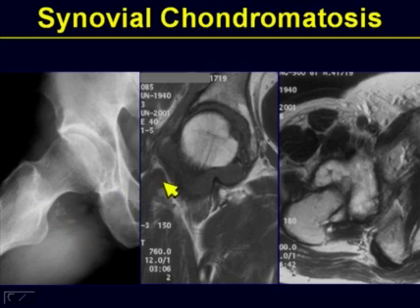and on a coronal image proton density you will see that there is indeed distension of the capsule by uncomplicated fluid. On the actual images at the level of the femoral neck, you'll notice not only the distended capsule but also some synovitis involved. But yet, as you look a little bit closer on the T2 image here on axial, you'll notice these signal voids representing synovial chondromatosis.